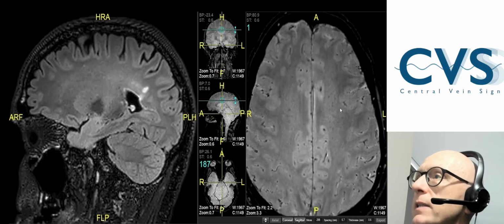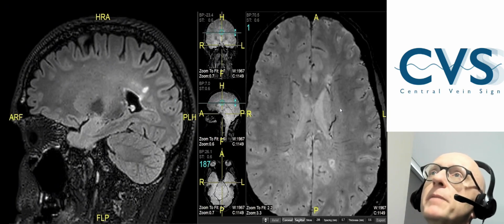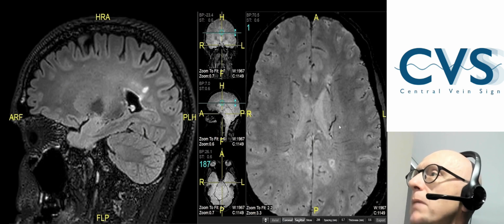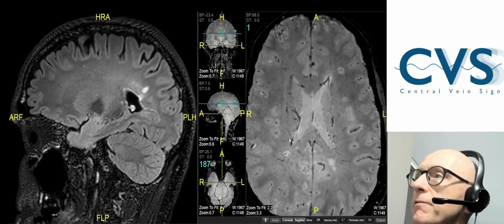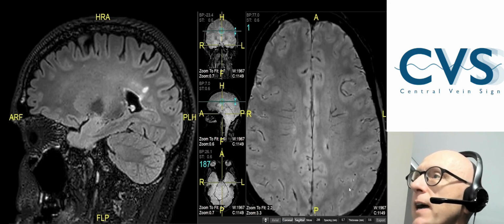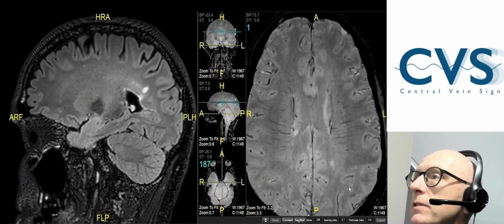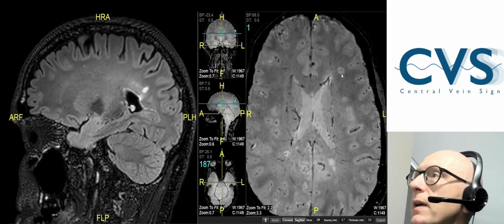When I'm looking at these scans, I do a count of the lesions. In fact, what I will often do as I'm going along is put a little marker on the lesion, so that I can come back and double check if I need, but also so that if I lose count as I'm going through the image, I can then come back at the end and tot up the number of arrows that I've got on lesions to see if I've got 6 or more lesions that I could use to help support the diagnosis.